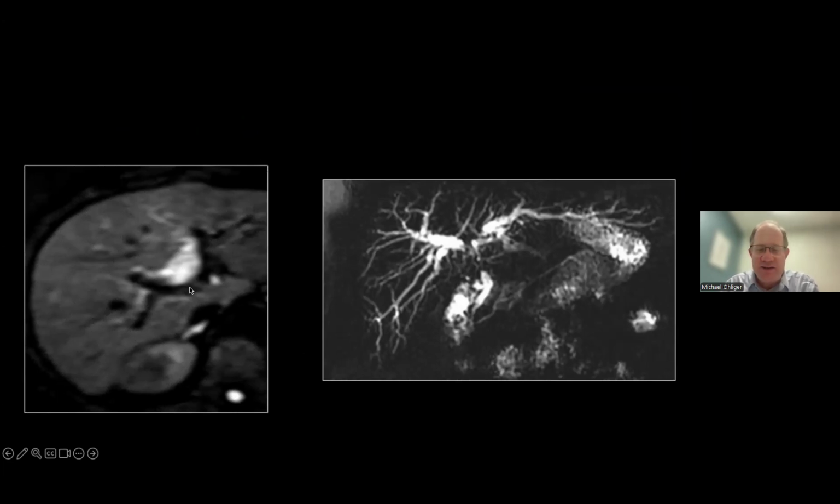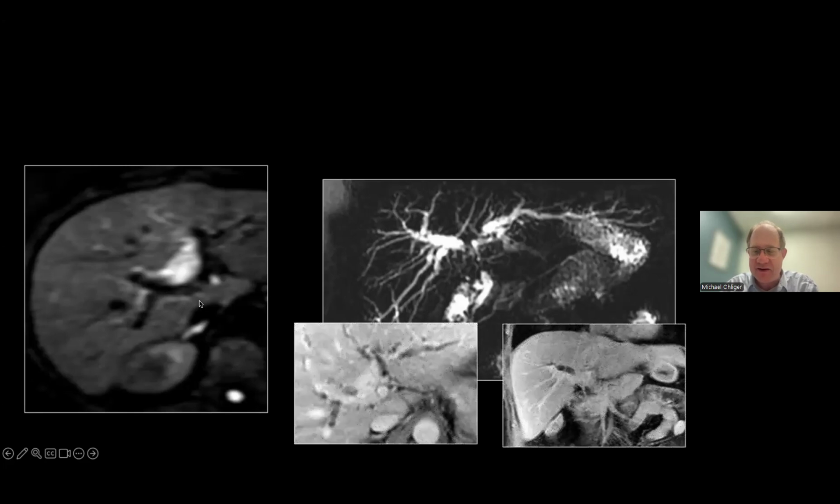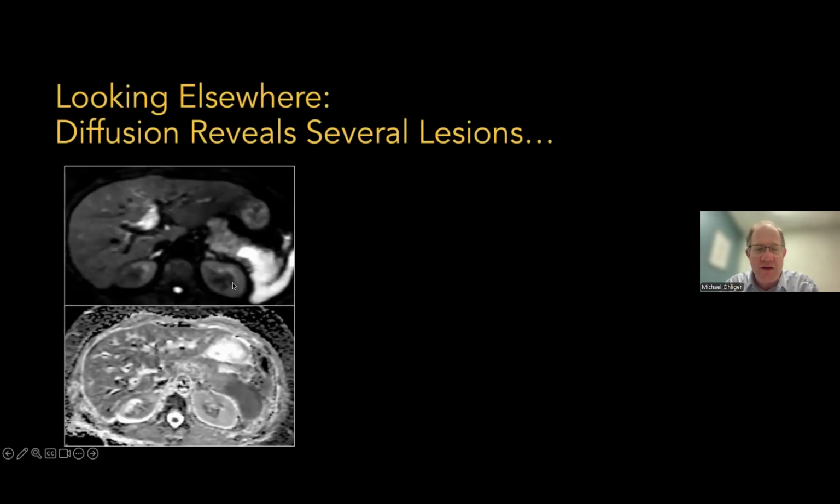Now, this is, again, a little bit of radiology inside baseball, but cholangiocarcinomas are really hard to see. So when I can see the mass, I get a little bit suspicious that it may be something other than cancer. And this is something that progressively fills in. You still think that it's cholangiocarcinoma, and you do have to take it seriously. But especially when you can see the mass really well, I will actually think of other diagnoses.